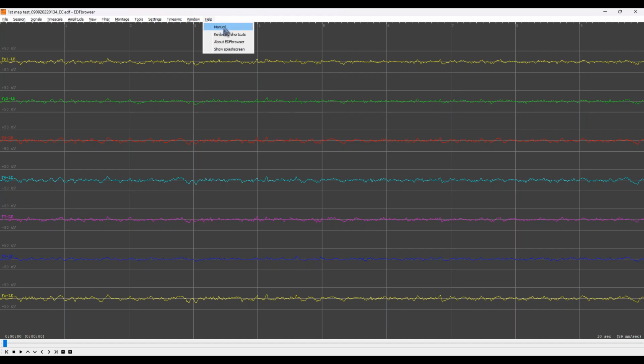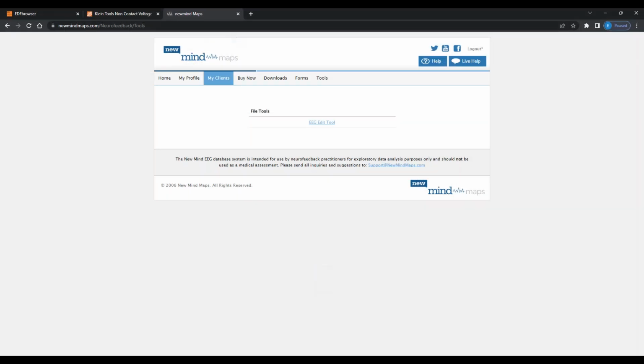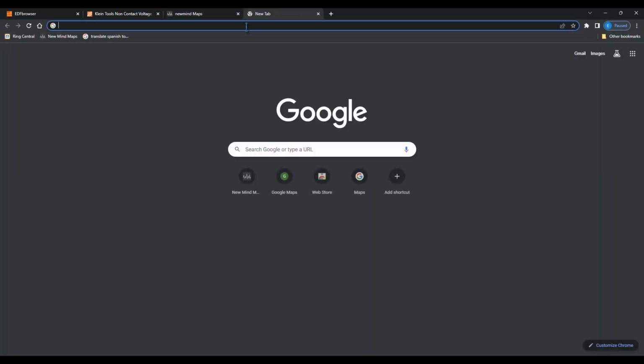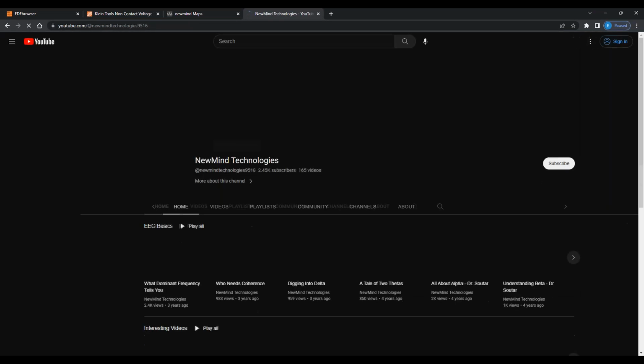So yeah, you can do a lot with this. There's a lot of features in this that I'm still learning. I had no use for this until I started working at NewMind, because the software in BioExplorer records an epics file, which you can't really import anywhere. It's a very useless file outside of the platform.